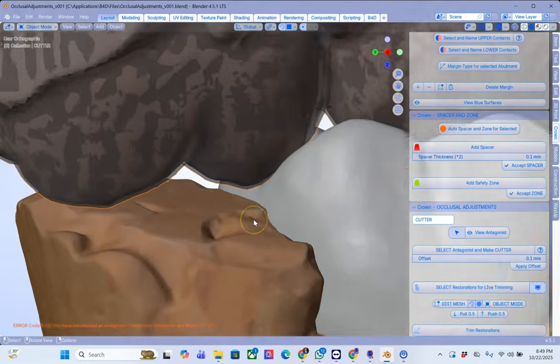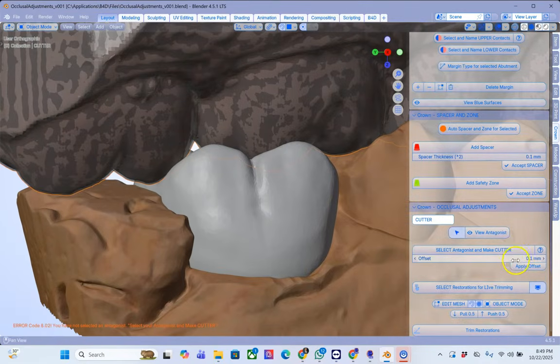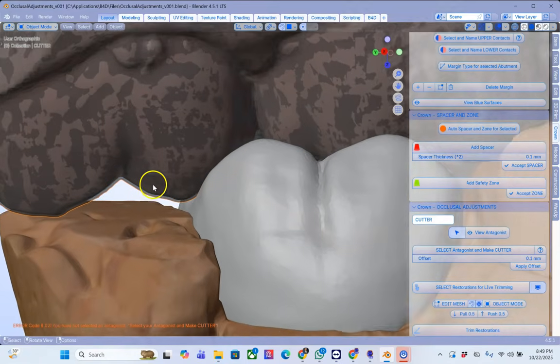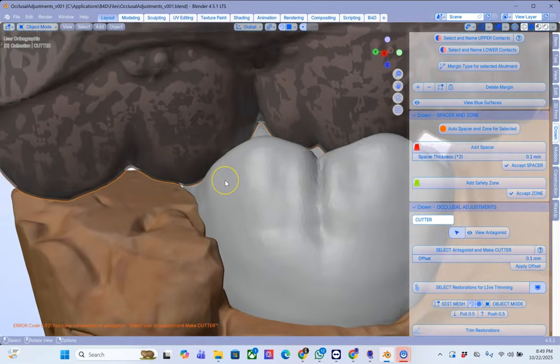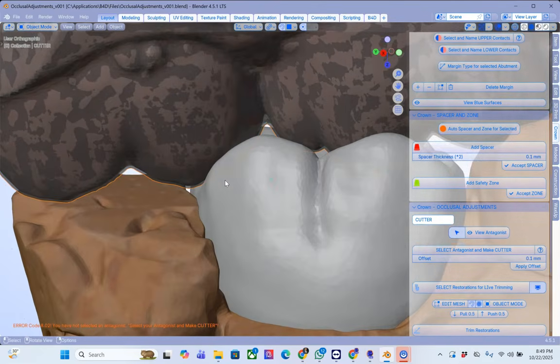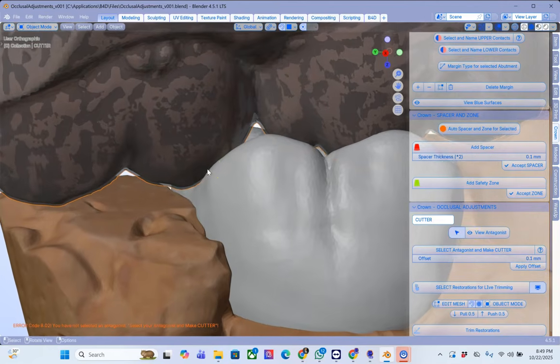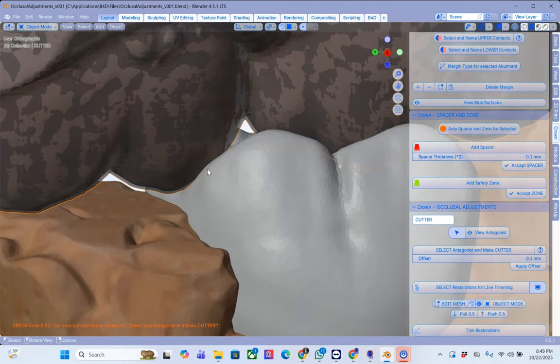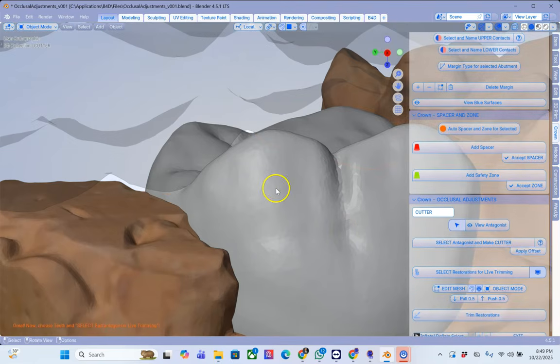It actually enlarges the model just a little bit by 0.1, and usually with an engineering offset it is 0.1 when it comes to implant parts or whatever. It's usually always 0.1 because we're going to accommodate. We can't have surface to surface because they would intersect each other. Apply that offset. Great.